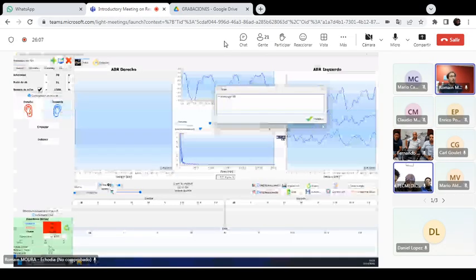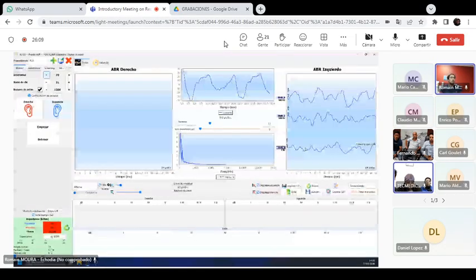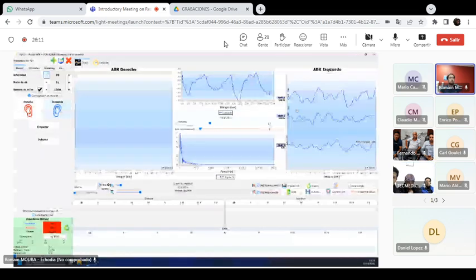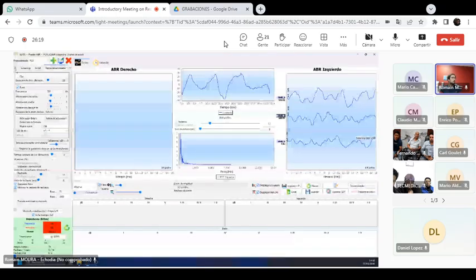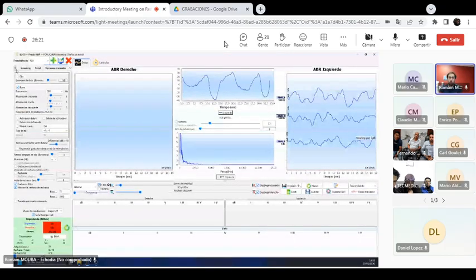Then you have notes directly on the curve, only for the masking, because there is no other way to record it. Is this okay for you?